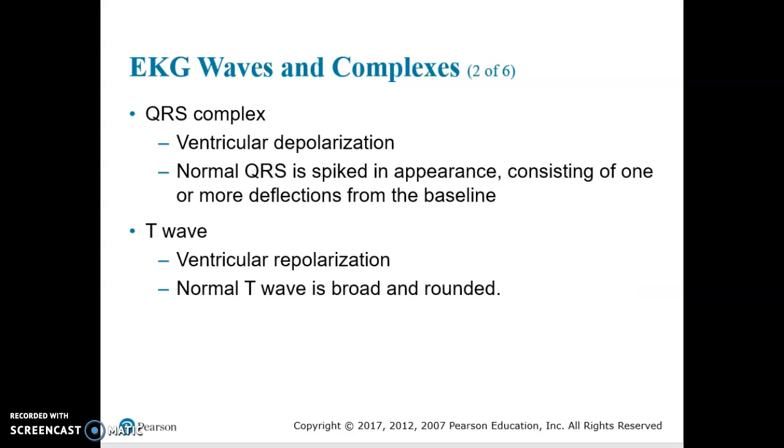Now we're going to talk about the QRS complex. The QRS complex represents ventricular depolarization. The normal QRS is spiked in appearance, consisting of one or more deflections from the baseline. The QRS is the most easily identified thing on the EKG strip. However, again, our shapes may vary.